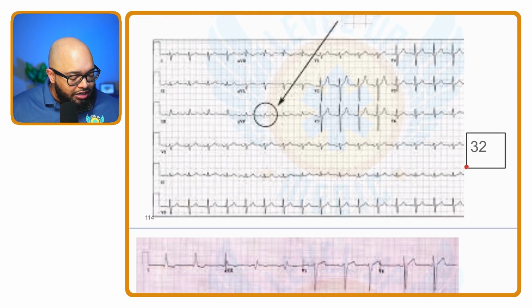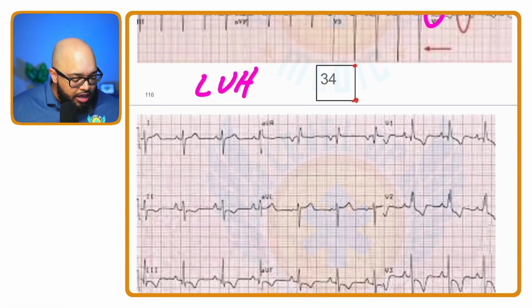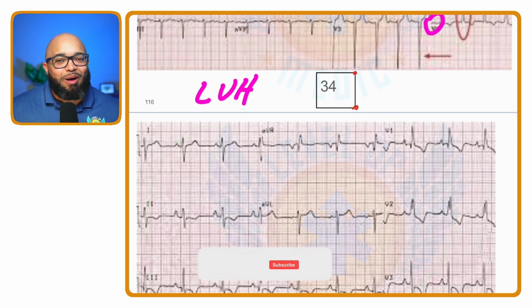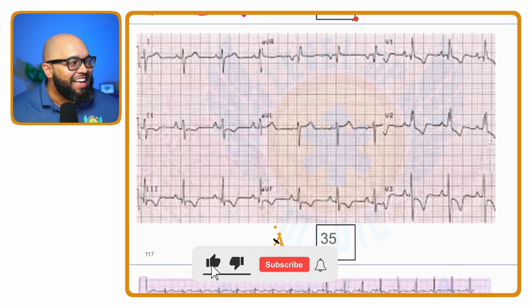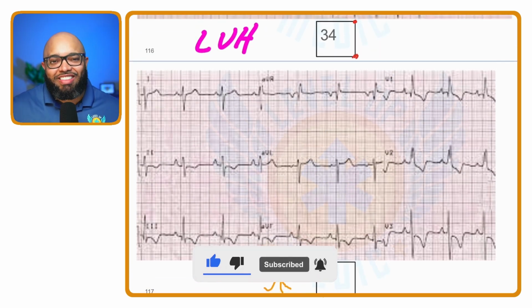Now, I'm going to leave these next ones to you. We already went over 34. 35, I want you to see what you come up with on 35, all right? This is a good example. There again, the answers are there at the end.